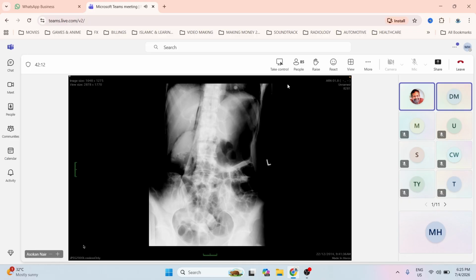So in this particular case, which do you think it is? The clue is there on the radiograph. It only involves the right side. So I think it's probably the D2 part of the duodenum. You are right, from the duodenum, but how did it happen and why did it happen? Again, there's a clue on the radiograph.